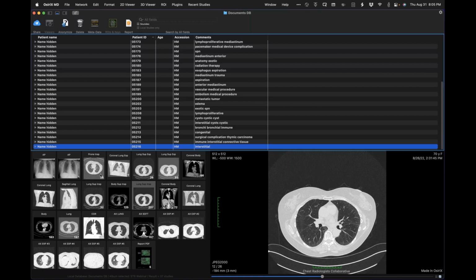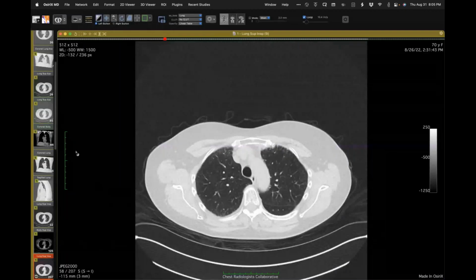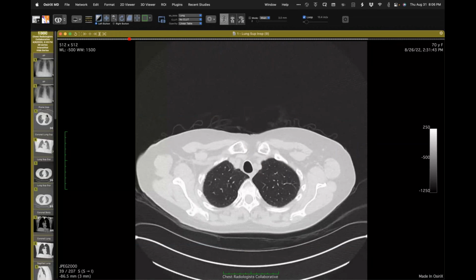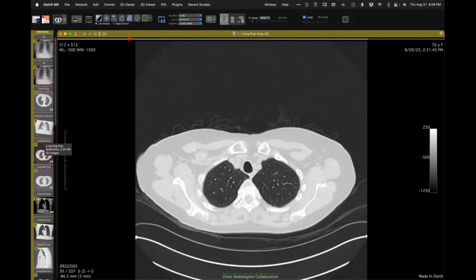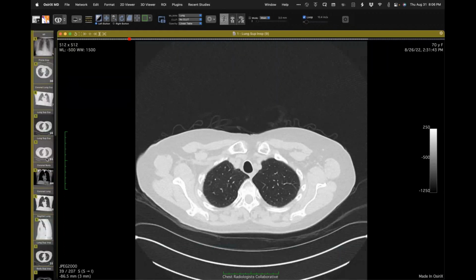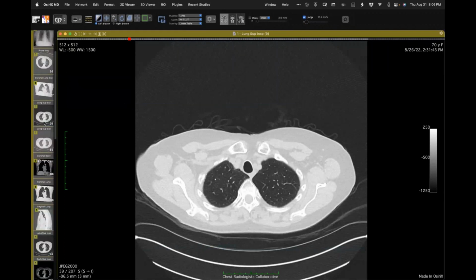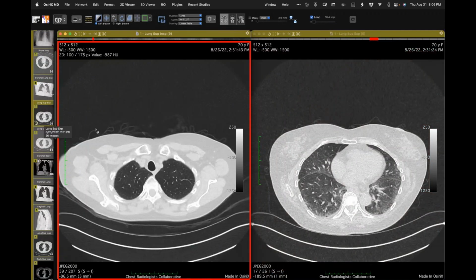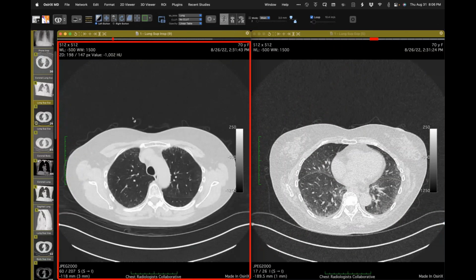So let's go and look at the CT. I'll start with this one, and I'm going to show you alongside it this one. This also shows you that there are places that still do rather unusual interstitial lung disease imaging.